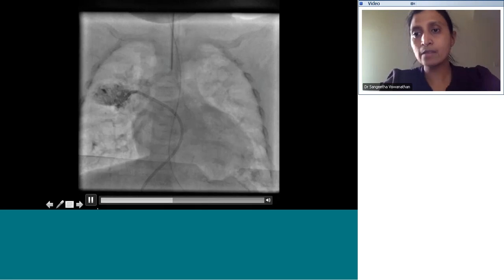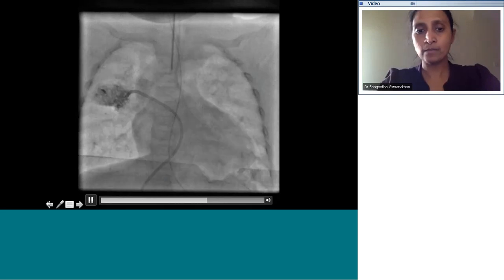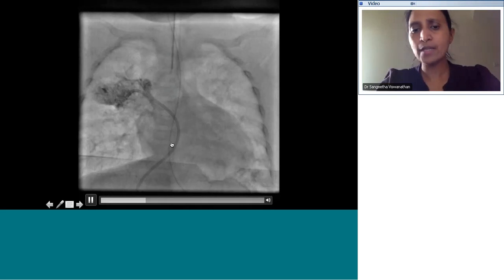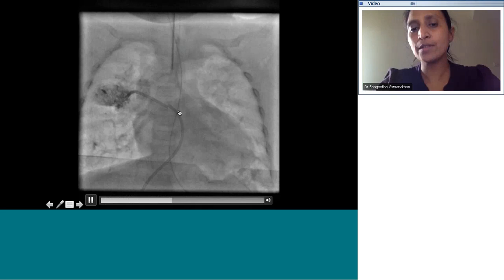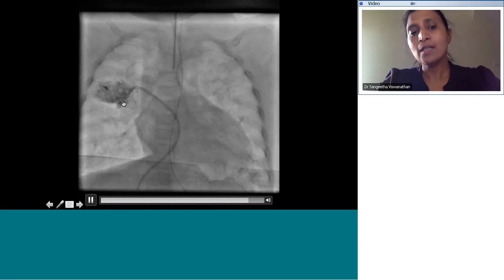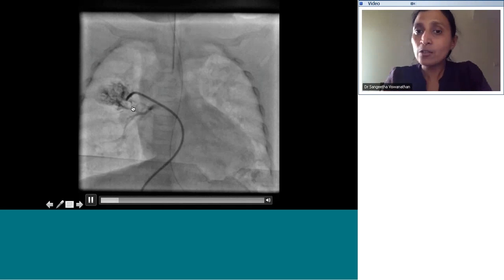Course of the catheter, quickly somebody? Where are we going from? This is pretty simple. IVC, RA, and then through the atrial septum, LA, and into the pulmonary vein. Very good. So you're wedging the catheter, and usually during this injection, you layer the contrast.